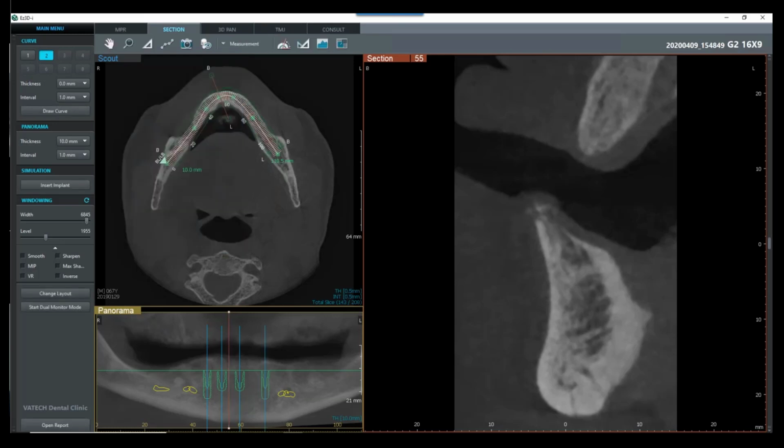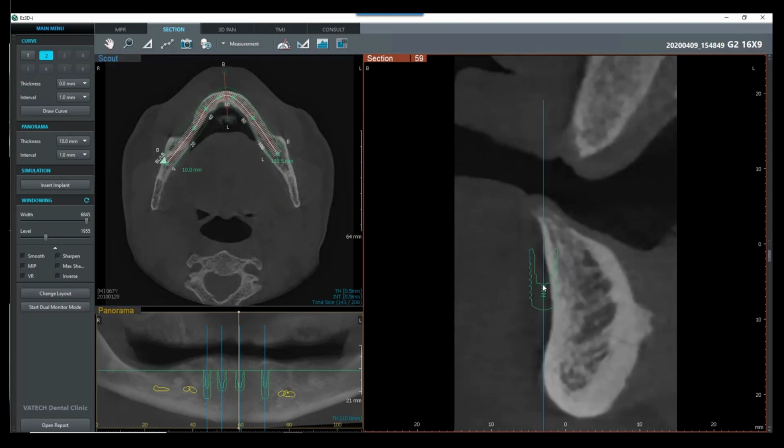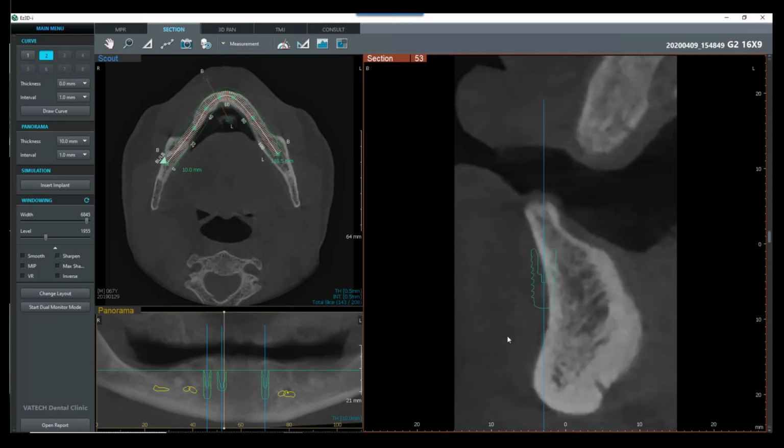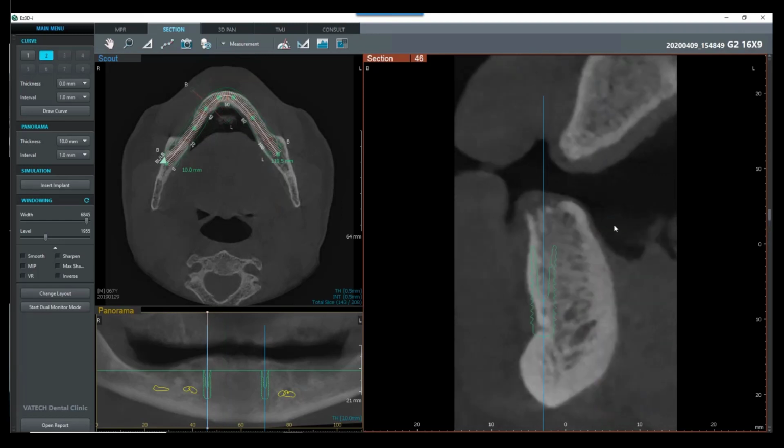So what I would really like to do now is look and see, are we in bone? So I do need to move this, and let's move this first implant back into the bone. We can do our rotation here. We'll rotate that. Let's go across for 25, grab that, move that into bone. We can go ahead and rotate, maybe move this around. All right.